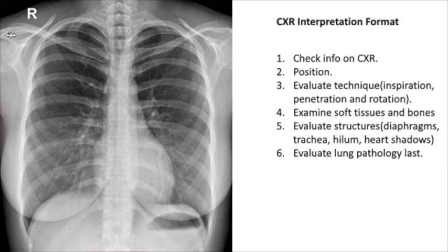In that order, you can start from top to down or down to top. That is your preference, but always compare both sides. It's very important for you to know that the lung pathology is last. Okay, it's very important to know.